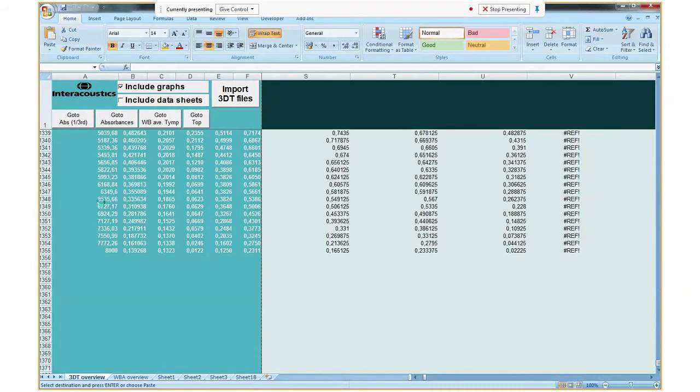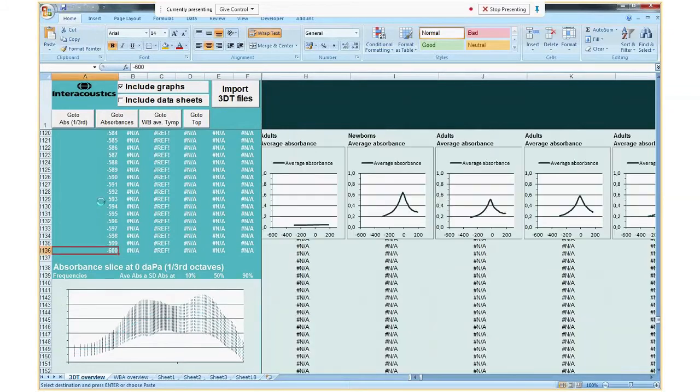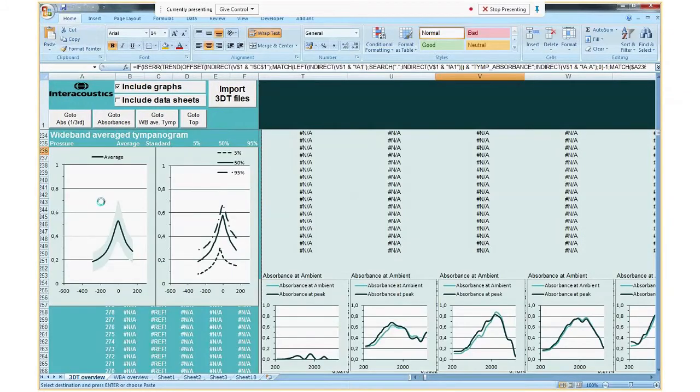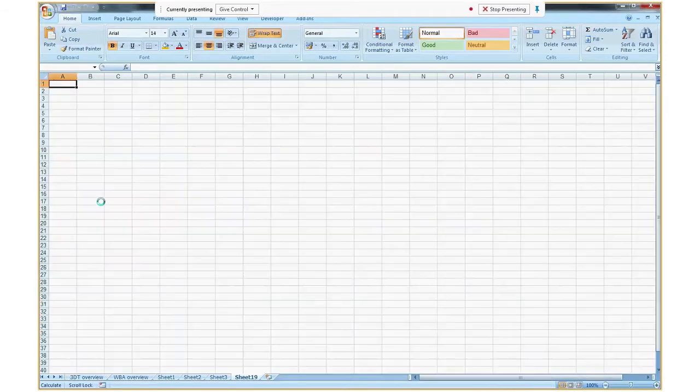Where are we? Number 80. 2 more to go, and then I will not do this again. Then I will just talk about how to look at this data, how to recognize also measurements that should be excluded from the data set.